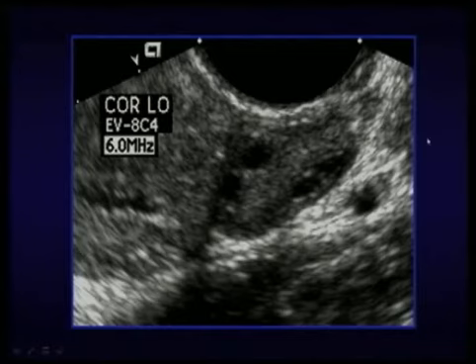So fortunately, most women have ovaries that look normal. We recognize them. But when we see things that are variations or out of the normal range, we know now how to handle them. Many of these are going to be physiologic or functional processes that will go away. Some will be neoplasms, such as dermoids, that we recognize, or hemorrhagic cysts, so we recognize those also and know how to treat them.